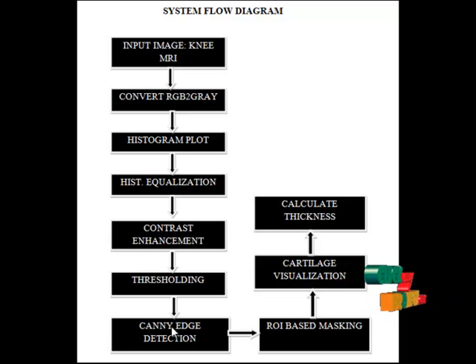Canny edge detection images are used in selecting the points of the ROI polygon. This masking separates cartilage from the femur, tibia and menisci. Here, Canny edge detection images show the boundaries of the cartilage. Finally, the cartilage pixels are segmented separately. From the cartilage images, we calculate the thickness of the cartilage. Finally, this thickness is used to determine whether the given image is normal or abnormal.